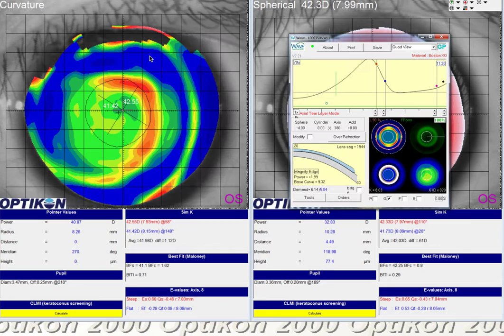Again, there is a fair amount of blue out here in the periphery, and although it's kind of difficult to predict exactly how the freeform pattern will look as opposed to this G-sim, I would still make the changes just in the horizontal meridian, because it does seem like it's not too loose vertically. So just lift the lens horizontally 15 microns on both the temporal and nasal side, and that should help address the patient's induced cylinder. So those are my thoughts. Best of luck on your case.